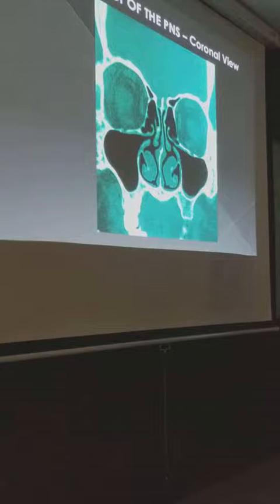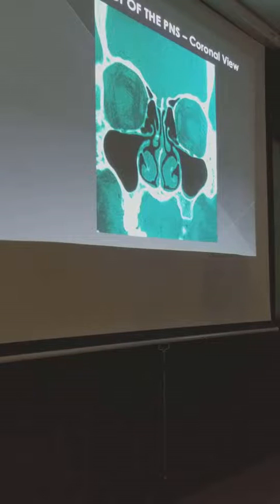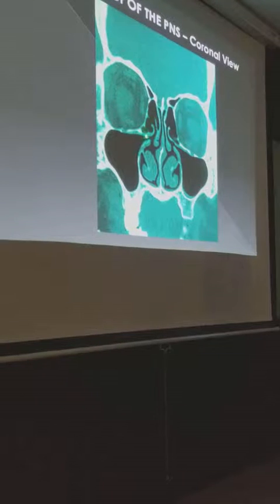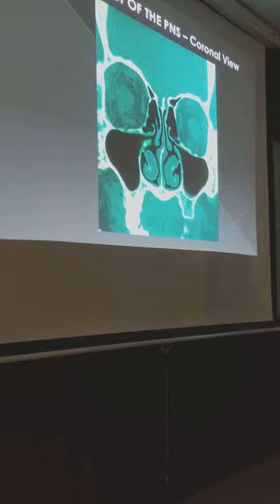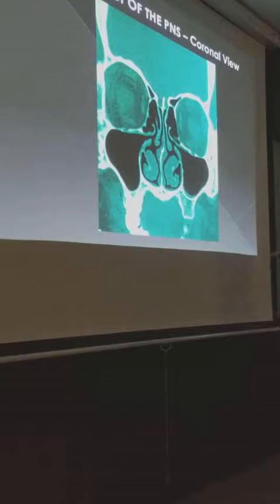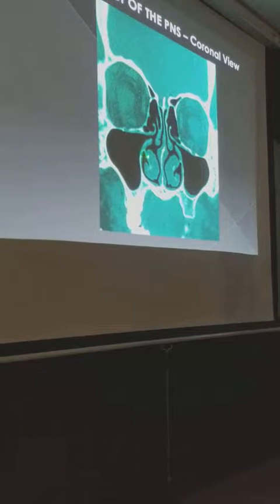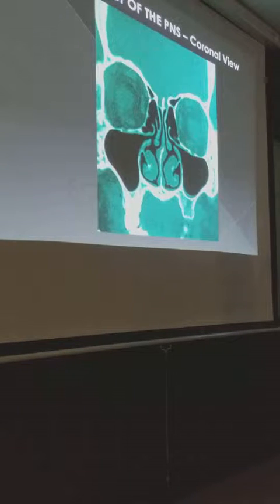Okay, so this is the lamella. Tama? Vertical pa ba? Vertical. Pero nakikita mo to, saan papunta to? Anong shape nito? Papunta saan? Pa-oblique na. So ano to? Ethmoid. Anterior ethmoid pa rin. This is your uncinate process. As I said, when it's downward slope, in its downward movement, you can see that it attaches to the ethmoidal process of your inferior turbinate.